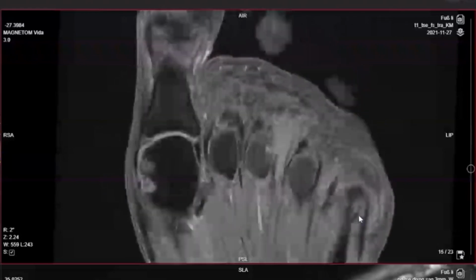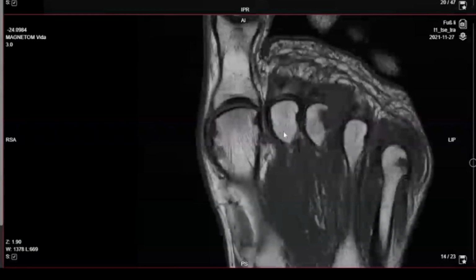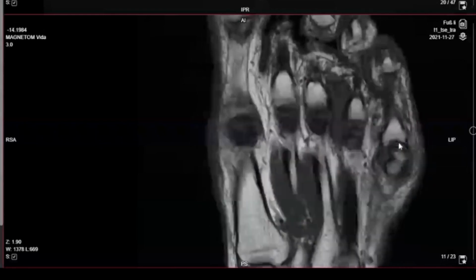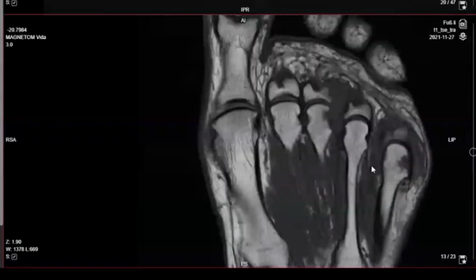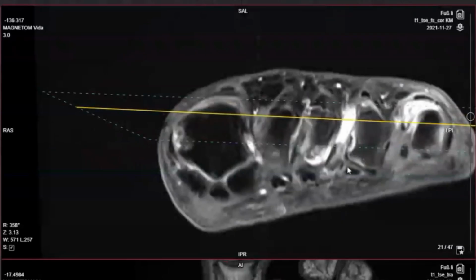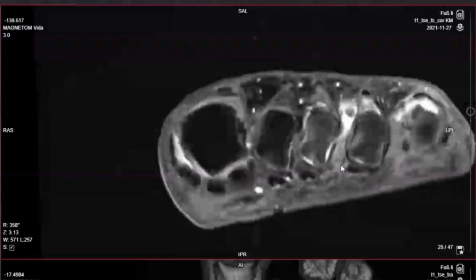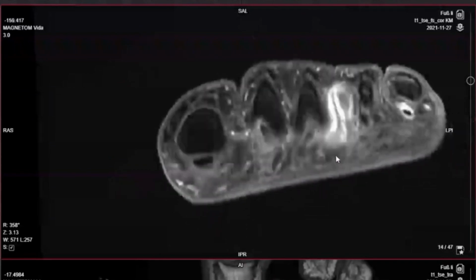This is a patient that likely has underlying inflammatory arthritis, as seen here with these erosions almost at all the MTP. In this distribution, we'd favor rheumatoid arthritis as the etiology. So we have this large interdigital enlargement. It is composed of this fibrosis, this perineural fibrosis, that is seen in both Morton's neuromas and pseudoneuromas.